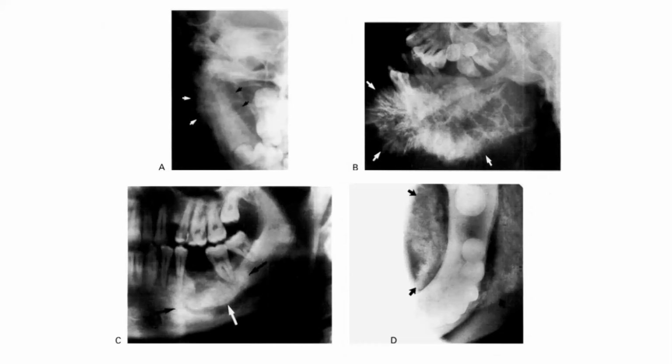So osteosarcomas are basically rare, rapidly destructive malignant tumors. From a radiological viewpoint, there are 3 main types. These are the divisions that we have: osteolytic osteosarcomas, osteosclerotic osteosarcomas, and a mix between osteolytic and osteosclerotic.